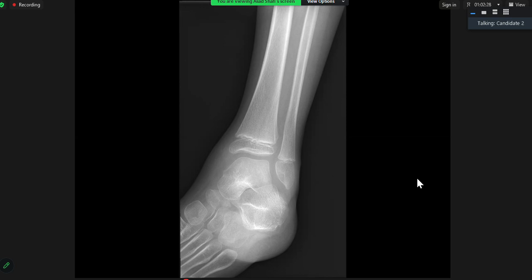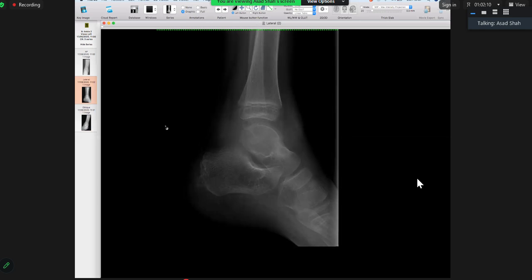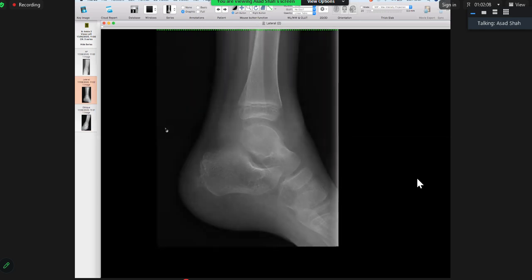Yeah, again, there is soft tissue thickening and haziness in the surrounding soft tissues. Besides this, in the talus, if it is projectional. So if this patient presents to you and you're reporting this, what's the next investigation you would advise? Obviously, everybody will go for MR, but is there anything else that you can do?